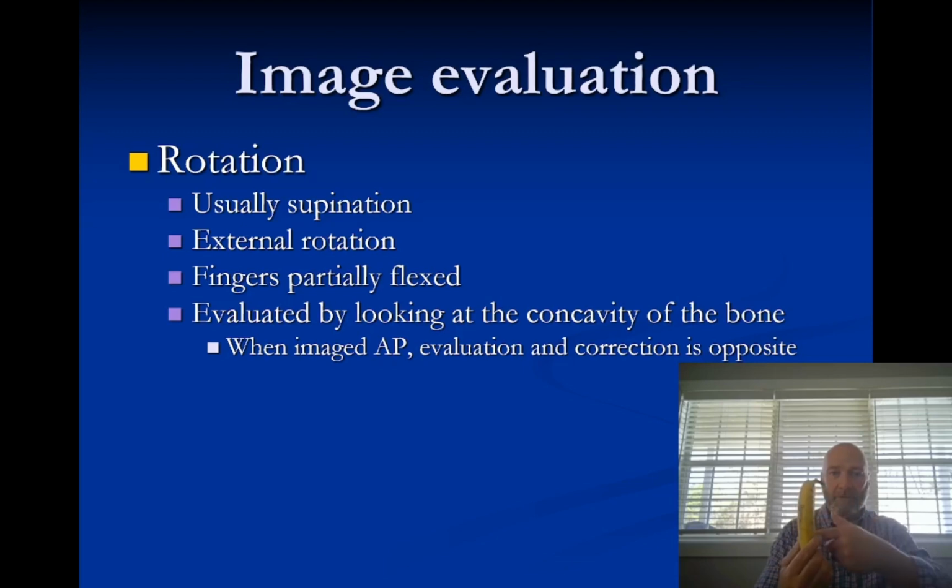So now we're seeing the concavity on the anterior side, and we also see an increase in convexity on the posterior side. So what we want is to see that hourglass shape on the PA, but what we don't want to see is any kind of concavity and convexity anterior to posterior.